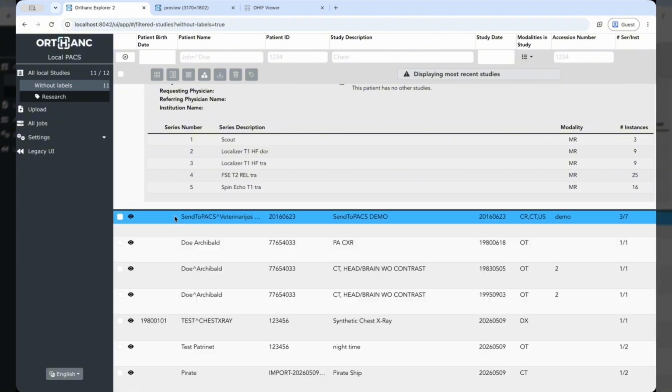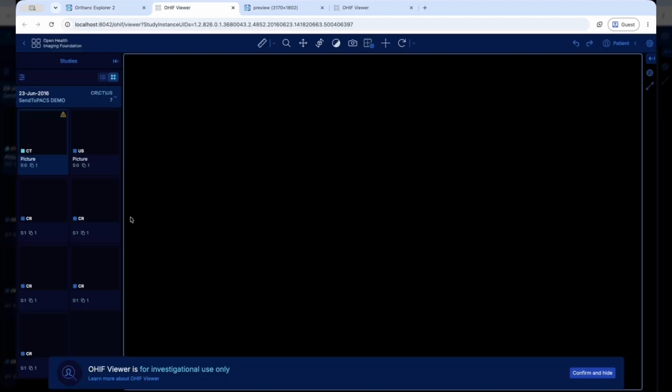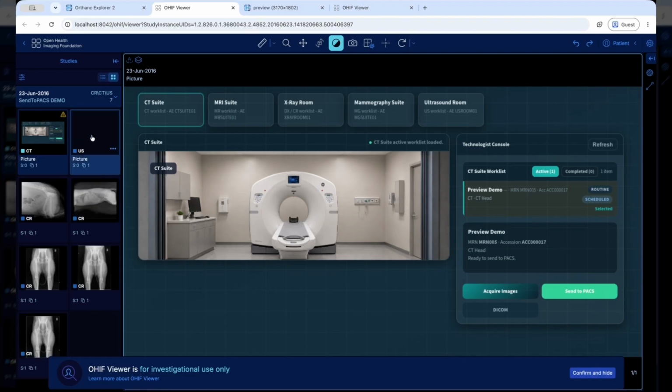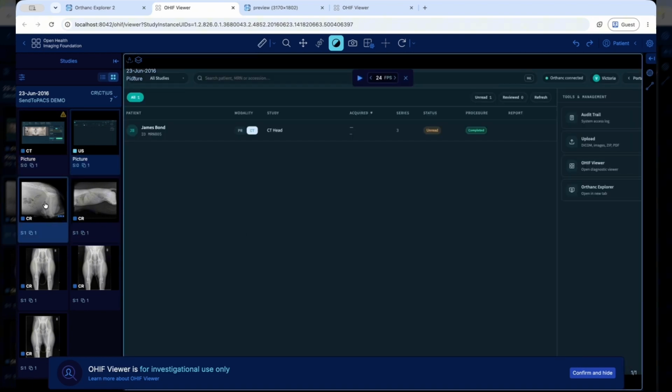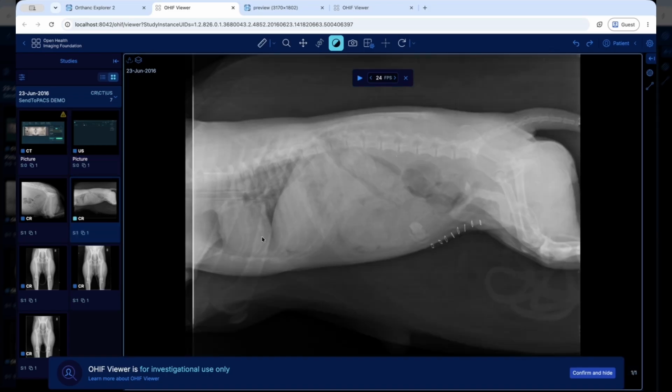So in my case, this is of course OHIF. Just to show you, as I click on this little eyeball, I'm taken over to the OHIF viewer, and this is my secondary capture. So this is the first secondary capture, the second secondary capture, as it'll load for me in a second. In OHIF you can see that actually it's a veterinary X-ray. Otherwise, that's what I have in this study prior to me adding these secondary captures.